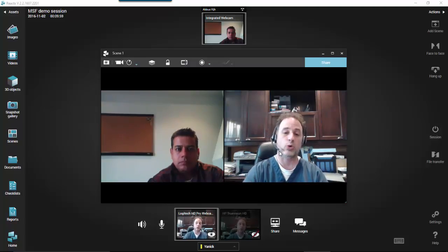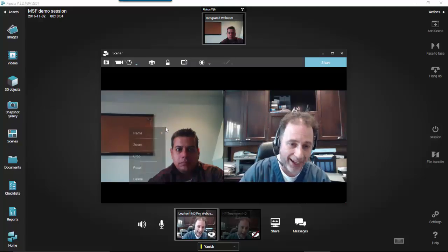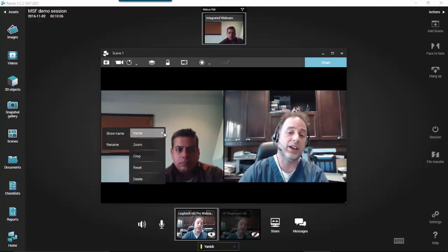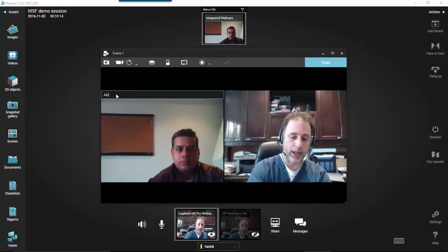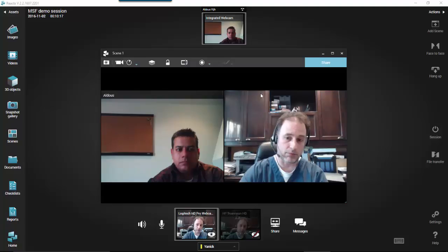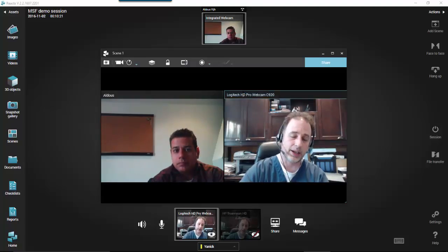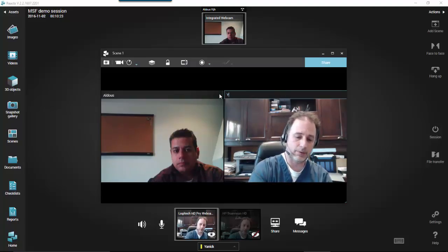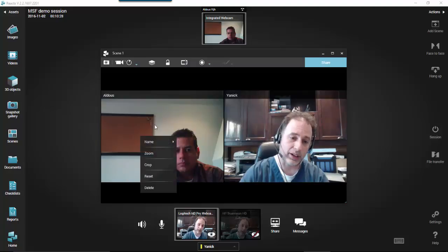Now, if I would like to remove one of the cameras, I go over it with my mouse, right-click, and then it tells me everything I can do. So if I would like to rename it, I could click on show name, and then click on the name and type Aldous, and then I can go over mine and do the same, show name, and then I click on it, and I can rename that.